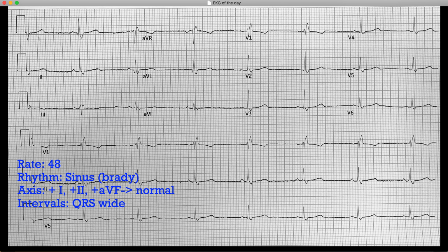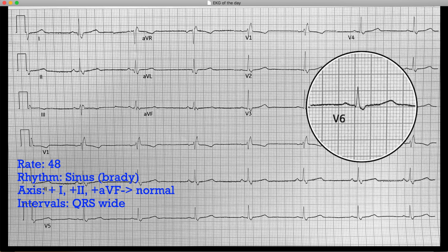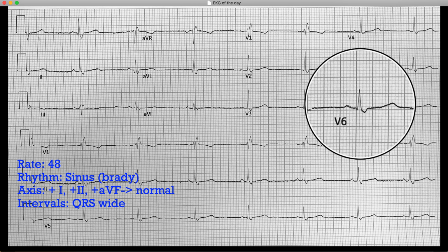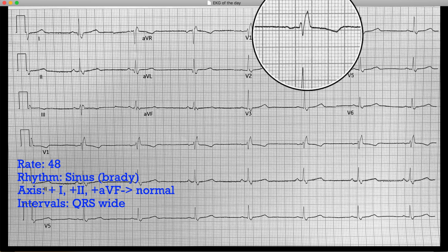We can confirm that by looking down in lead V6, because we see a positive deflection with this kind of slurred negative fat thing right here where the cursor is. That complex and that complex look like a right bundle branch block. Without belaboring the point of a right bundle branch block too much, let's just run through a brief explanation.